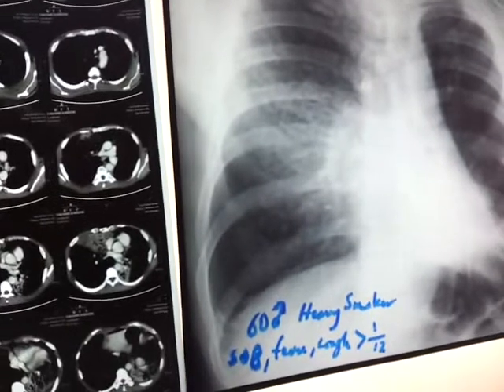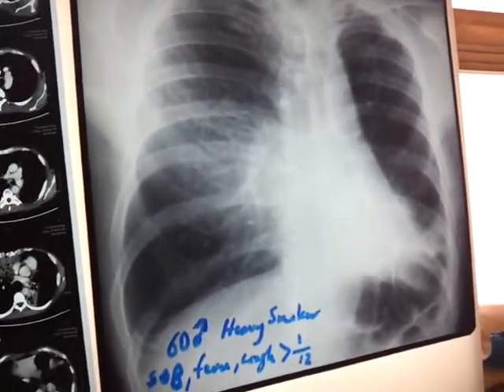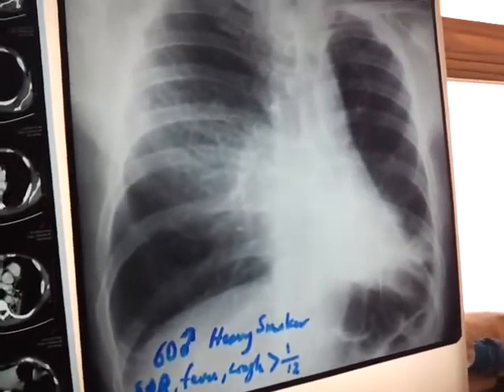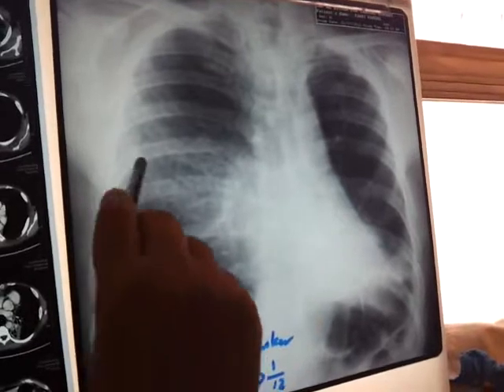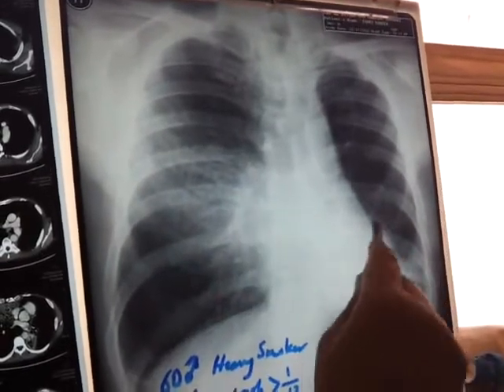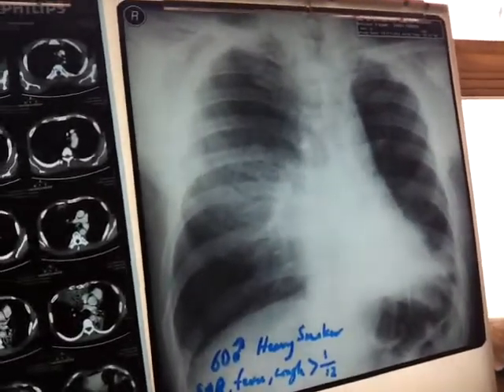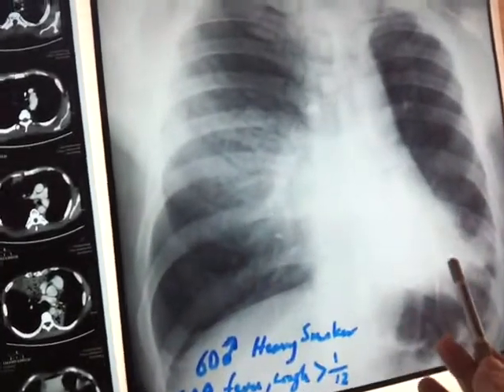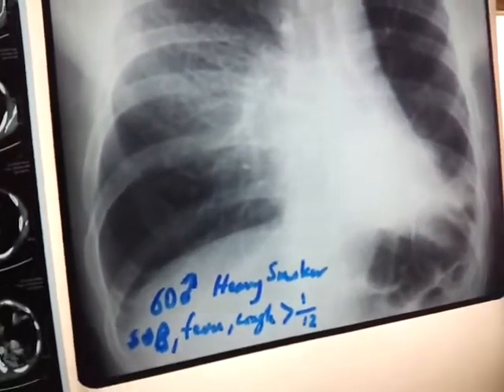Usually pneumonia occurs in the winter time, in the spring, and because Iraq is now in the summer, therefore this pneumonia could be what? A Legionella pneumonia. Usually Legionella pneumonia has multiple lobe involvement. The patient is mostly elderly.